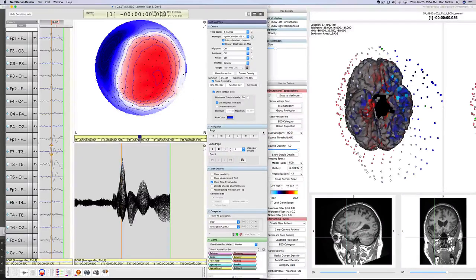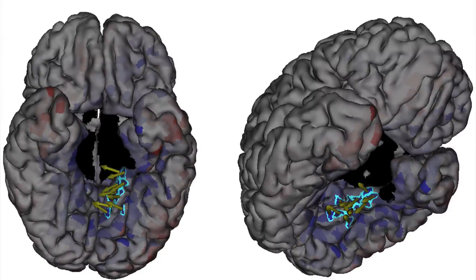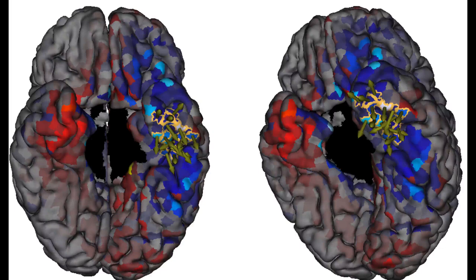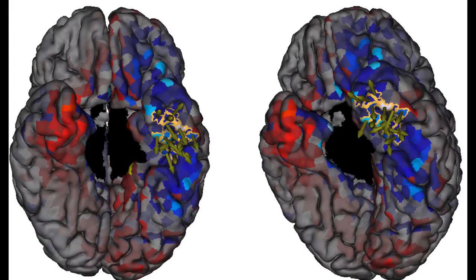So we have two key brain regions that we have to understand the propagation of this epileptiform activity. One is in the left posterior region. We look at the dipoles that are generated from each cortical patch. The other is the left anterior region. These regions become candidates for testing seizure onset, such as in long-term monitoring, potentially leading to targets for surgical resection. And also these can be targets for non-invasive neuromodulation, such as with the geodesic transcranial electrical neuromodulation technology.